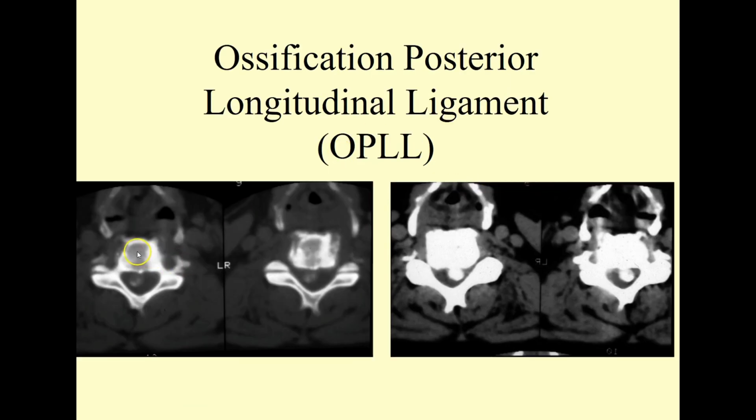Here we have again, take a look at bone, find the outer layer, looking at CT, looking at the central canal. Now this would tell me that, oh, here's the cord. Cord lives right behind the vertebral body. Well, then we go to soft tissue window. I need to ask you, well, what is this right here?